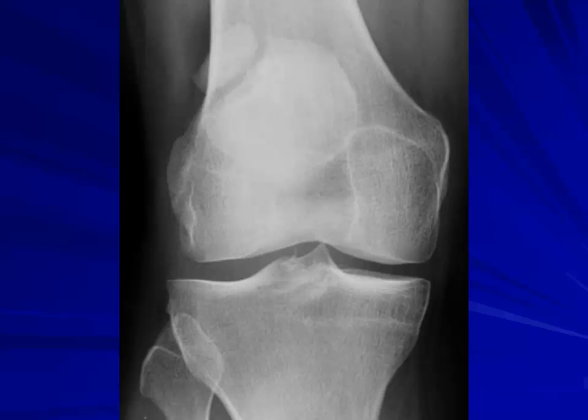The pattern recognition is important in all nuclear medicine. You need to identify what your patterns are and how you're going to interpret them. So with patella, to my understanding, to my knowledge, if you see a diffuse uptake, it is less likely to be pathological. It may be associated with degeneration, but not necessarily there will be any intervention.